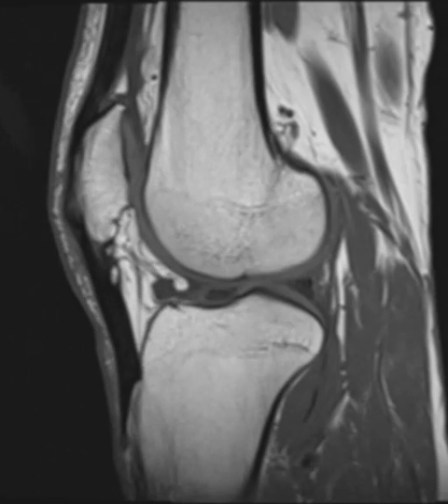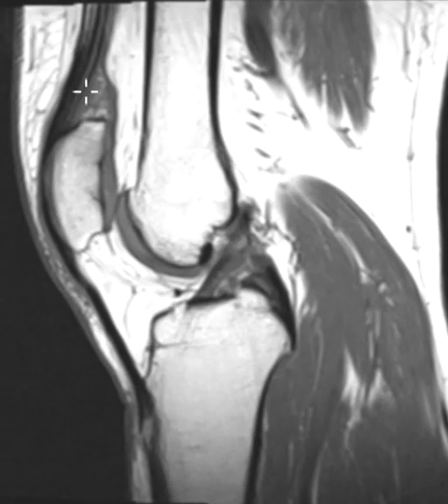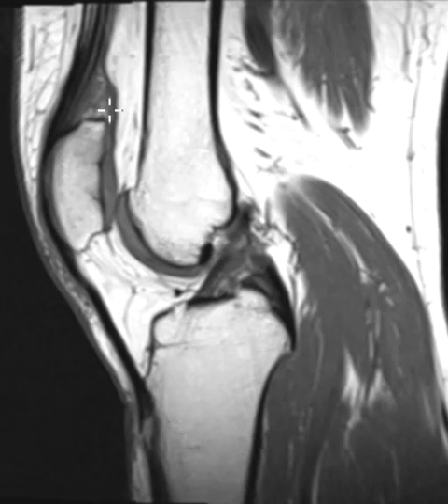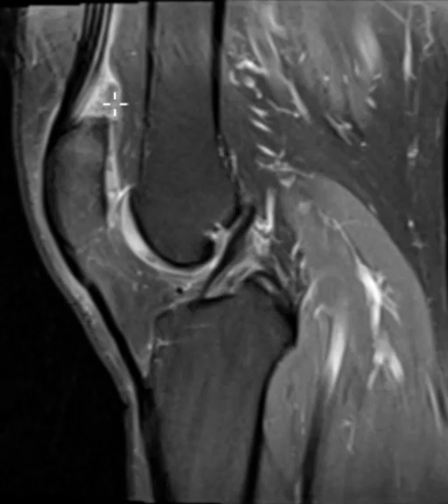Now we're going to look at one that is not normal. And this is the quadriceps fat pad up here. Instead of being fatty like the prefemoral fat, Hoffa's fat pad, look how gray and foggy it is. It looks a little plump too, like it's expanded. This is what we call quadriceps fat pad impingement. On this one, this is sensitive for fluid, and you can see this is fluid, so it's inflamed, edematous.